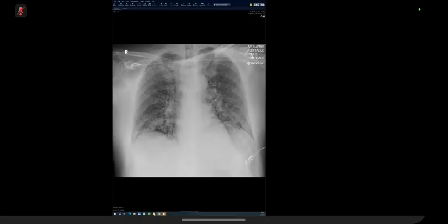So this could represent again cardiac failure. Nodules in cardiac failure. No, I think they are vascular markings, prominent vascular markings. Okay, so if you're saying all of these are end-on vessels and this is just pulmonary congestion, if that was true, why does he have an ETT and why is the heart not enlarged? So this could be a non-cardiogenic pulmonary edema.